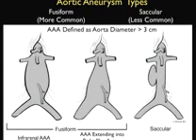We can see in the picture in the middle that these fusiform aneurysms may extend from the abdominal aorta down into the iliac artery. In this picture, we see extension down into the right iliac artery. Now let's take a look at the saccular aneurysm as shown in the picture to the right. Notice here that it's defined as a localized outpouching of the abdominal aortic wall. These saccular aneurysms are much rarer than the fusiform aneurysms, which will be more commonly encountered in the emergency department. But remember that the definition of an AAA is an abdominal aortic aneurysm greater than 3 centimeters in diameter.